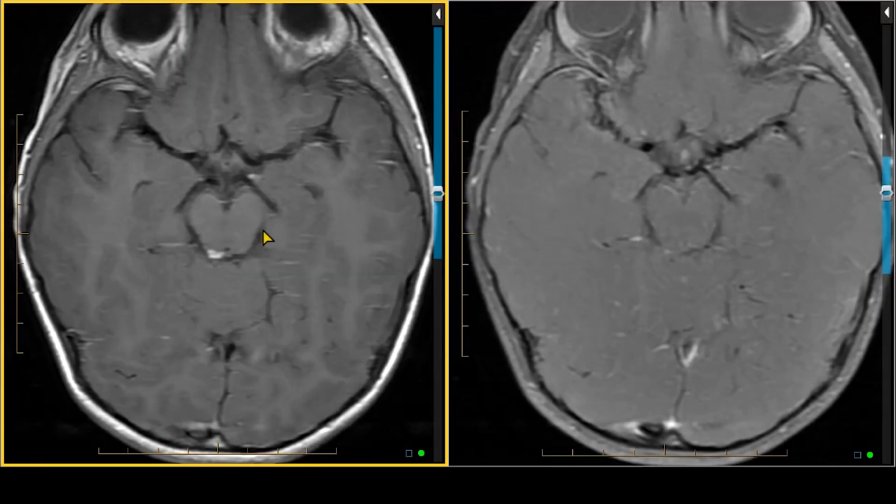A tectal plate lipoma will often show up at either the 5 o'clock or the 7 o'clock position, and that's exactly where we see it in this individual. So being aware of the normal location for this lipoma, as well as being aware of the MRI techniques you can use to confirm the fatty nature, fat-suppressed imaging, both pre and post-contrast in this case, it allows you to confidently state that this is an incidental lipoma that does not require follow-up and should have no implications to the brain development.